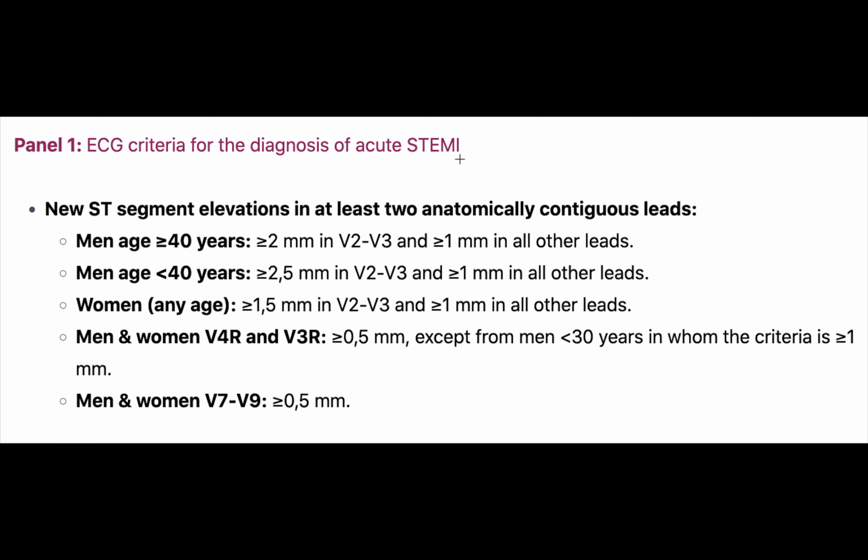And then infarction just basically means something died. So an ST elevation, usually if we have an ST elevation, that means we're having a myocardial infarction. That means cells in your heart are dying, and that's a problem. And so this is the criteria of, okay, when is this actually typically happening?